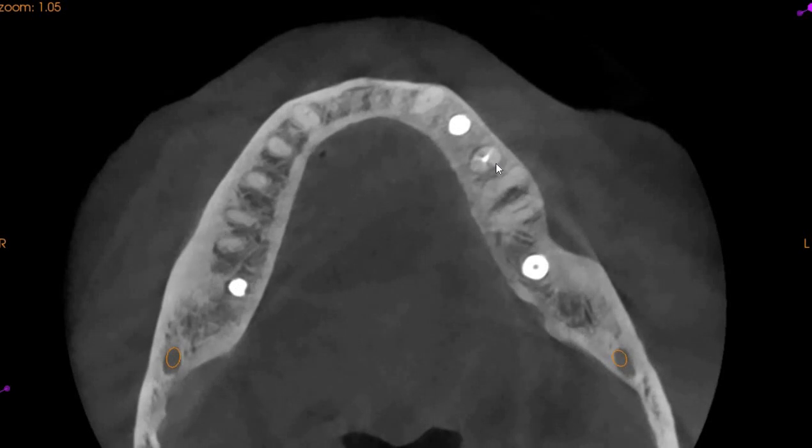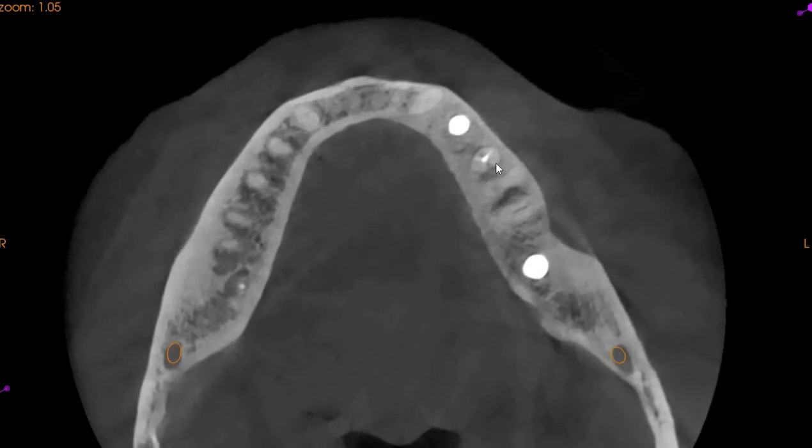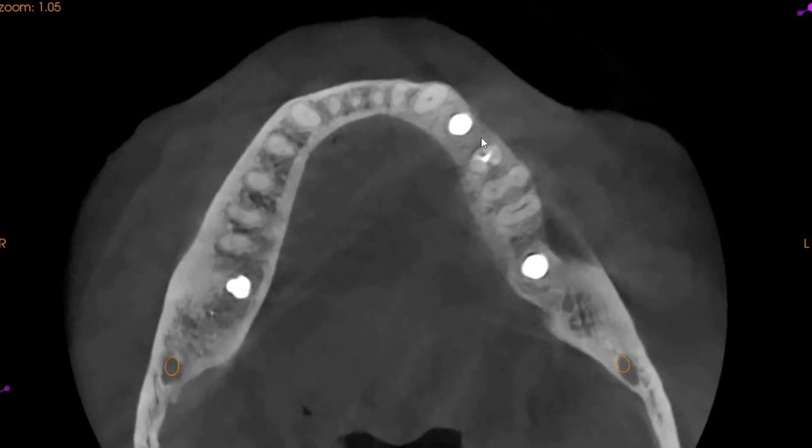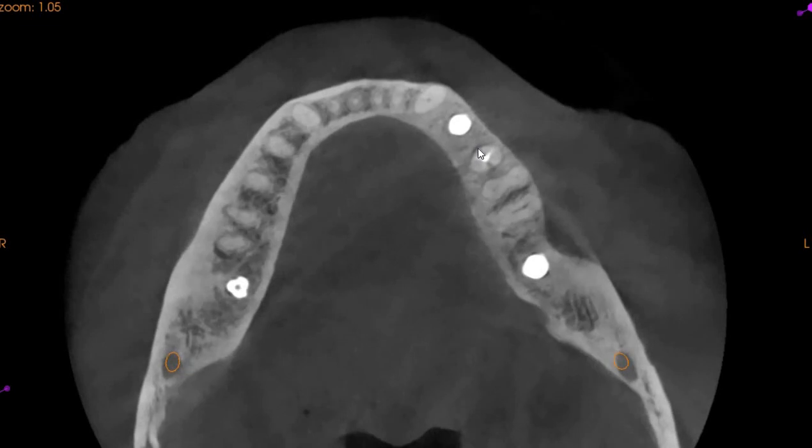But if the distal aspect is where the patient is finding problems, we do see a line on the axial view right here. And if it is the mesial aspect, we can see a little bit of a PDL thickening, this could be a periodontal lesion. We're willing to listen to the clinical symptoms and we can discuss with the doctor if there are any findings that we can correlate with the clinical scenario.